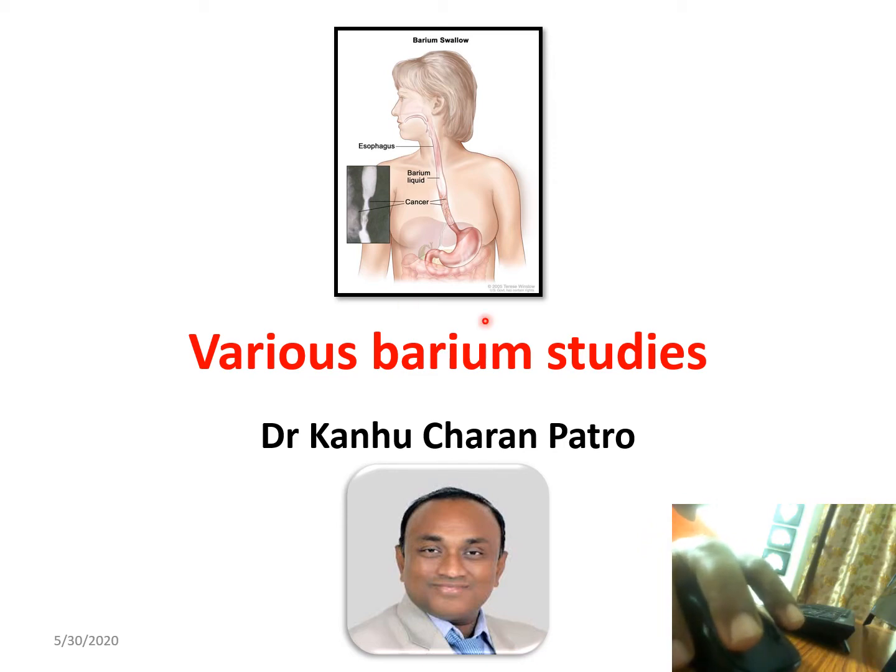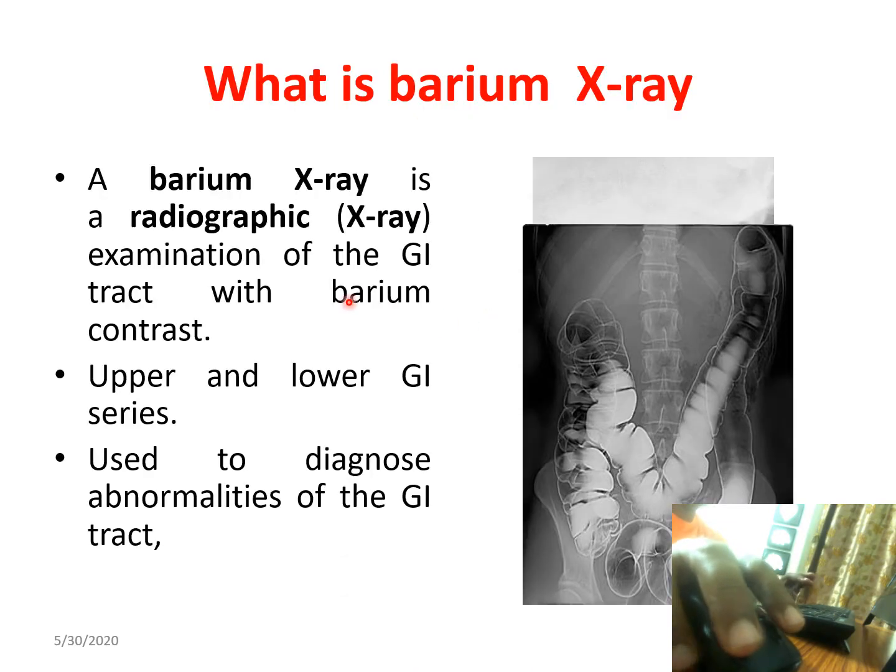Today, I am going to discuss various barium studies practiced mostly in oncology practice. So, what is a barium study? A barium study is a barium X-ray, or radiographic X-ray examination, of the upper GI tract and lower GI tract, used to diagnose various abnormal, benign, and malignant conditions.